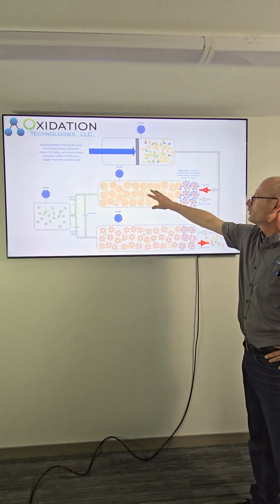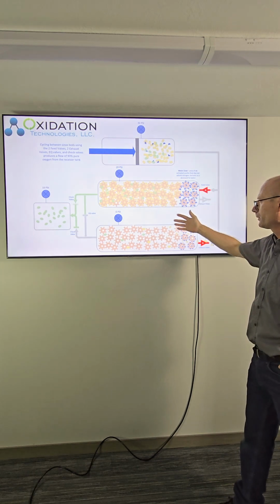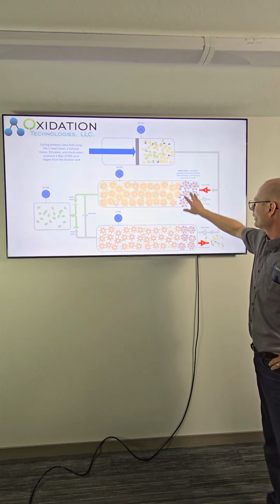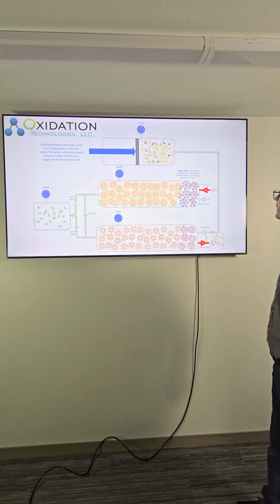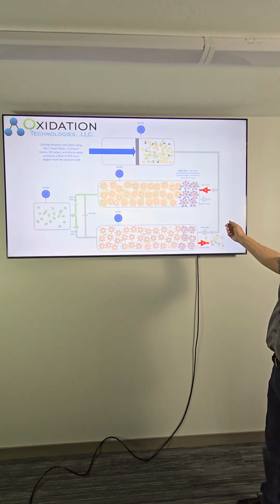So once we've got some pressure built up, then we open up this feed valve and start letting more air in. And in the process, this exhaust valve has opened, so it's releasing the nitrogen, bringing out the water vapor as well. And we notice here that we end up with this zone at the inlet of these sieve beds that we call the water zone. It's the area of deactivated zeolite. It doesn't absorb nitrogen anymore, but it does act as a desiccant to remove the water vapor.